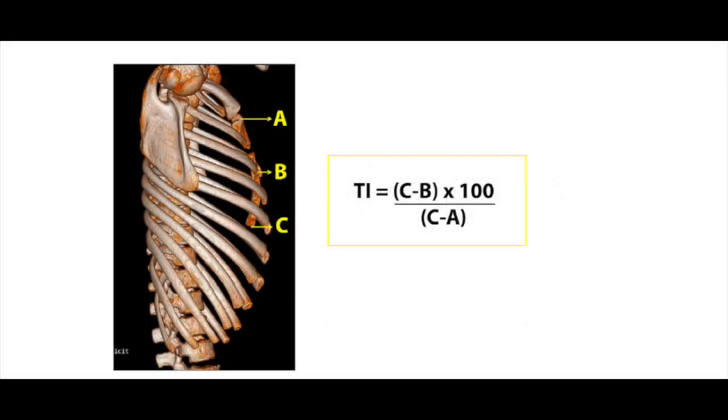And so we've now done 2 out of the 3 main areas that we're going to measure. So chest cavity, heart itself, and then the final one is just one measurement of the vertical amount of depth of compression, because we don't have any other measurements for how high up the sternum is compressed inwards. Obviously we have things like platythorax and very large compressions, and sometimes it's just the very bottom of the sternum that's compressed. So we've chosen one measure of how much of the sternum is dipped in, and it's called the Titanic index.